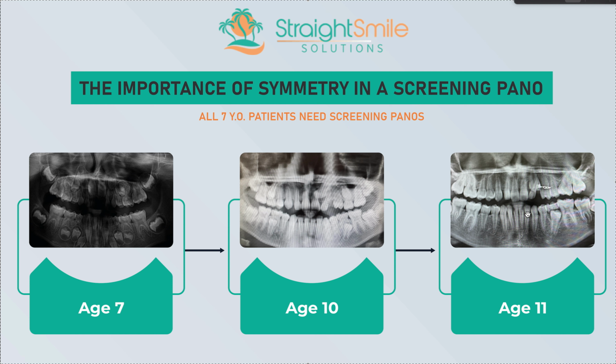But I wanted to try it because I heard one course at a summit where they talked about it. About this time we figured out that we did have a bony defect. So number 10, or upper left 2, was actually extracted. Boo, so sad. This is now erupted. It is being aligned, and there's a tiny little space here because this is a peg anyways. And she'll get a Maryland bridge, and then she'll get a tiny little implant later. But all is going well, and no braces.